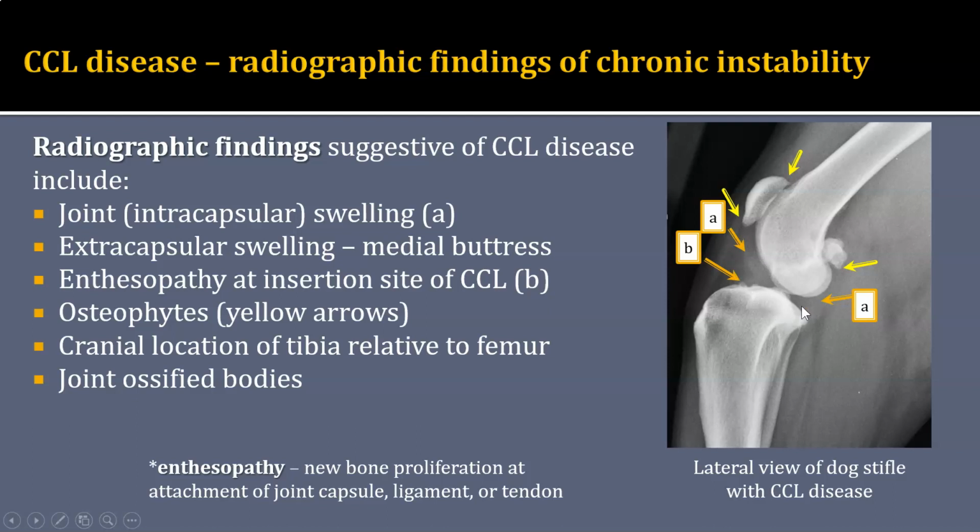This intracapsular joint swelling may be effusion, but it may also be some hypertrophy or thickening of the joint capsule as well as effusion.